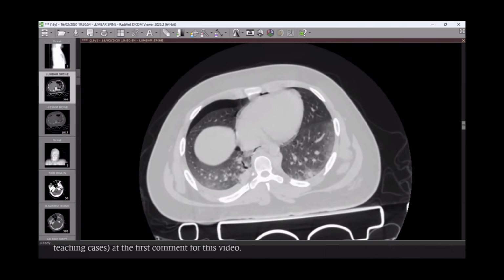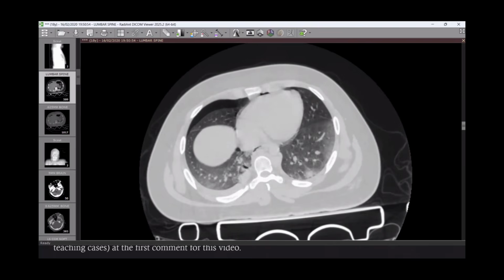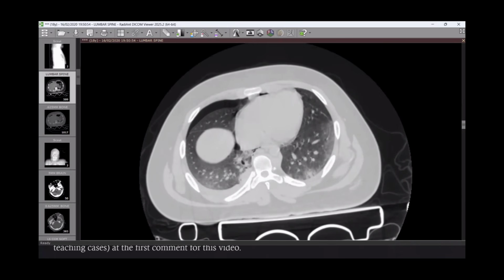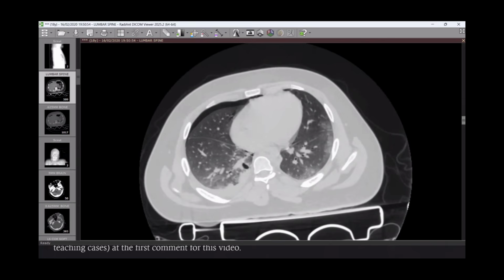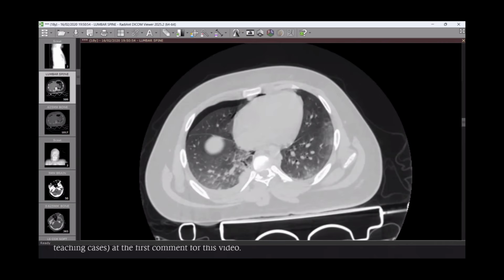Okay, this laceration may lead to bronchopleural fistula, maybe not. If we have hemopleural effusion or hemopneumothorax on the right side, and we inserted a tube and failed to evacuate the pneumothorax and hemothorax, then we can think of bronchopleural fistula. But at this stage, you can say we have a lung laceration or pulmonary laceration.